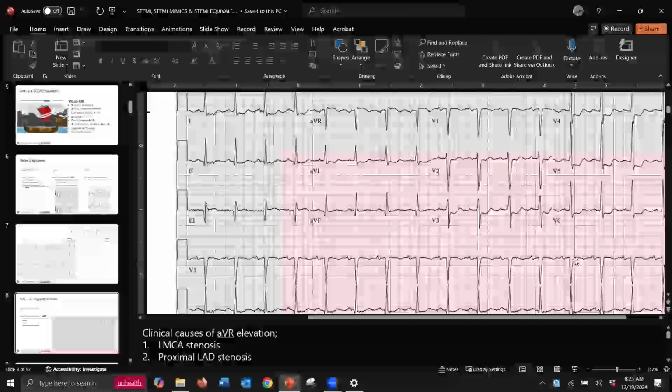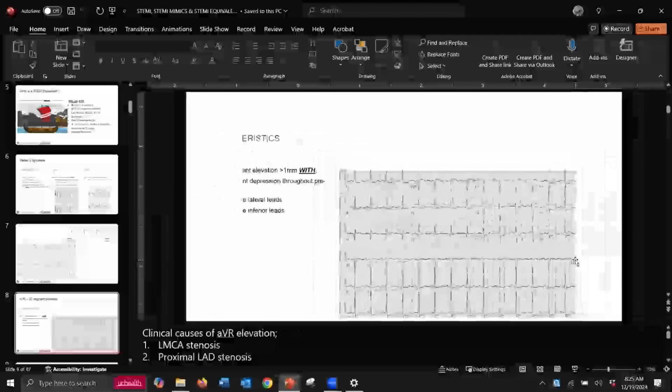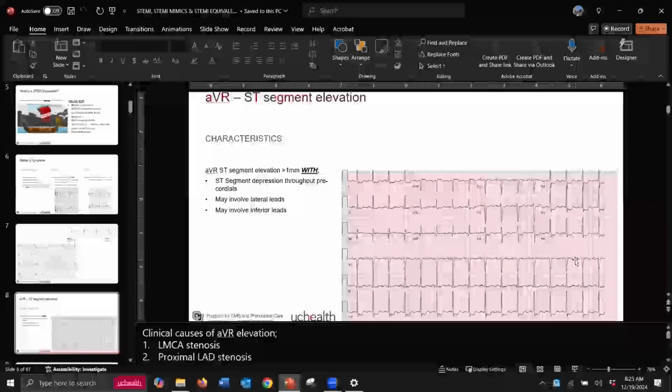But it doesn't meet STEMI criteria, STEMI alert criteria. What do you think? Andra, what would your response be? Drive faster. Bingo. Exactly. All of our providers would see that. And Eve just made a very valid comment. Not all of our providers would see that, right?